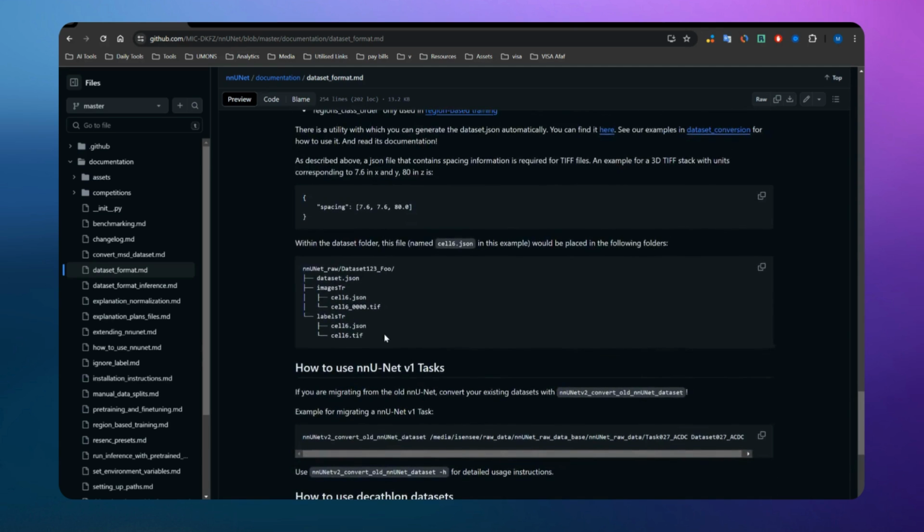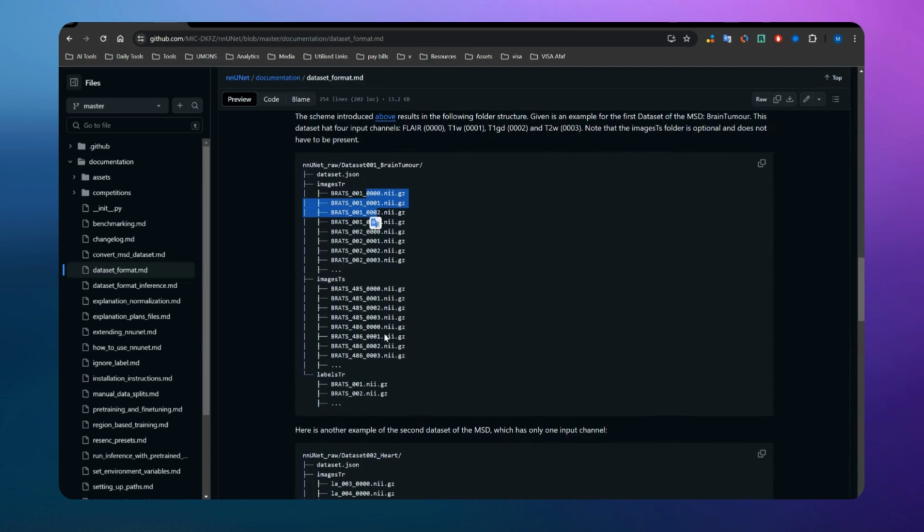Yeah, then the idea here is that you have two types of indexes. You have these parts and you have these parts. Okay, and then for the labels it should be something different. For the labels you have only the three indexes here.